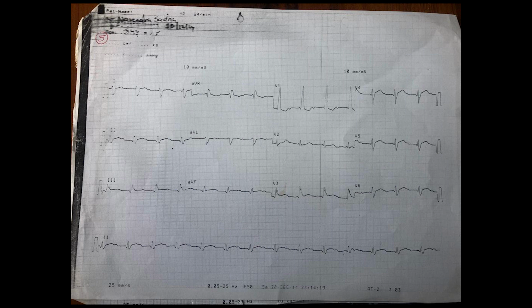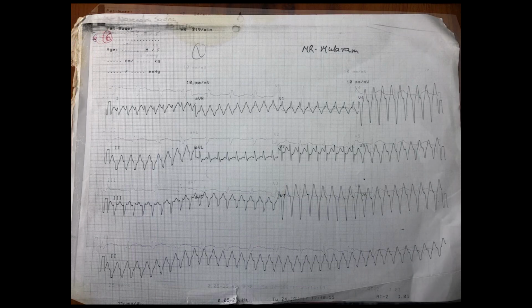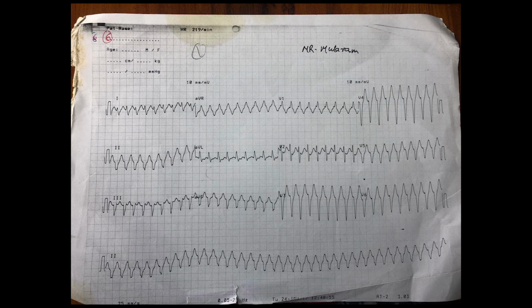The commonest causes of right axis deviation are right ventricular hypertrophy, right ventricular dominance, lateral wall MI, left posterior hemiblock, chronic lung disease, acute cor pulmonale, and reversed arm electrodes, so the right arm lead is attached to the left arm and the left arm to the right arm. And many times in children you see rightward axis, which is a normal variant. That's all. Thank you.